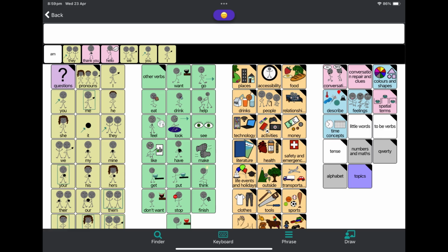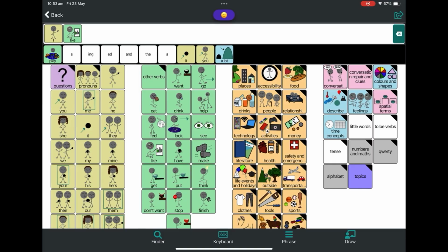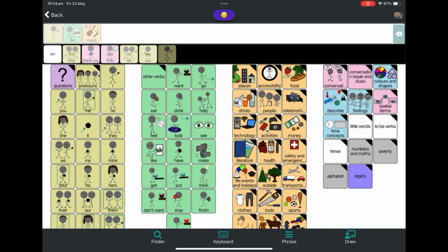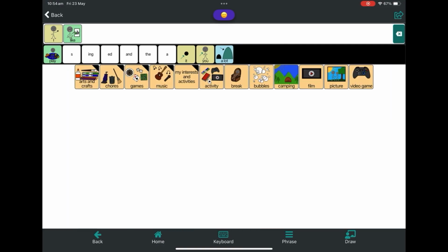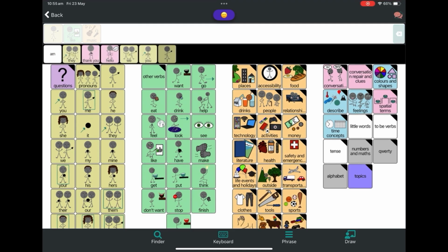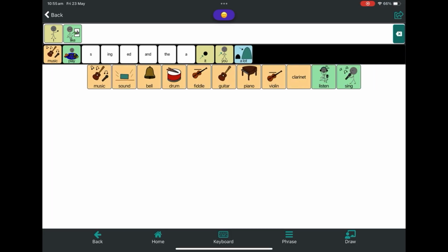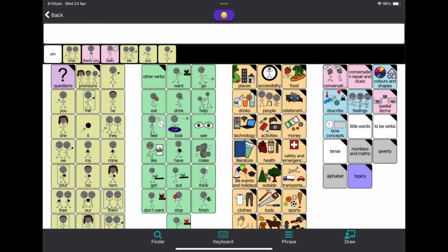You can customize what is spoken, choosing between message buttons, all buttons, or only speaking when you hit the message bar. There are no inbuilt touch accommodations.